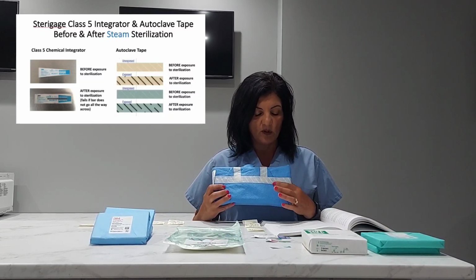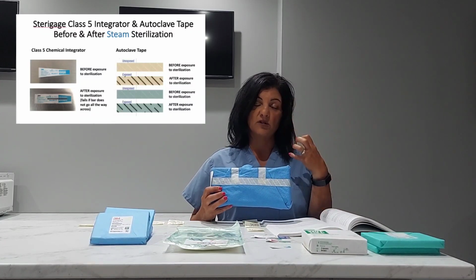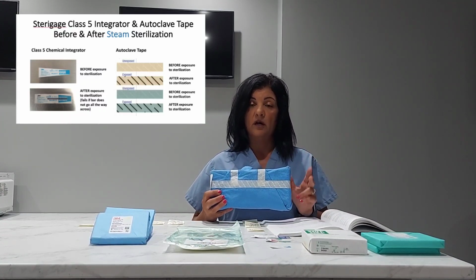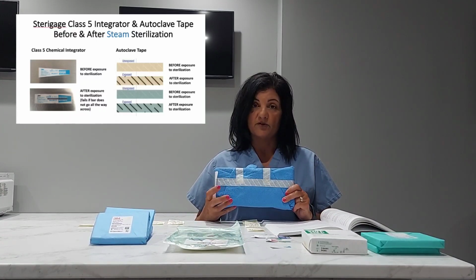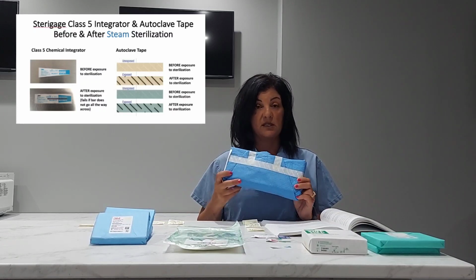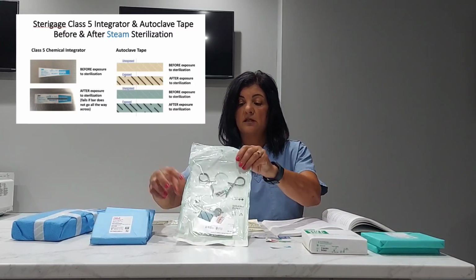So this will turn from cream to black, so the stripes will turn black. That's a visual indicator to me that this type 1 indicator has reacted to one of the 3 parameters for steam sterilization. So that's my first indicator that the package was either unsterile, such as this one, or sterile, such as this one.